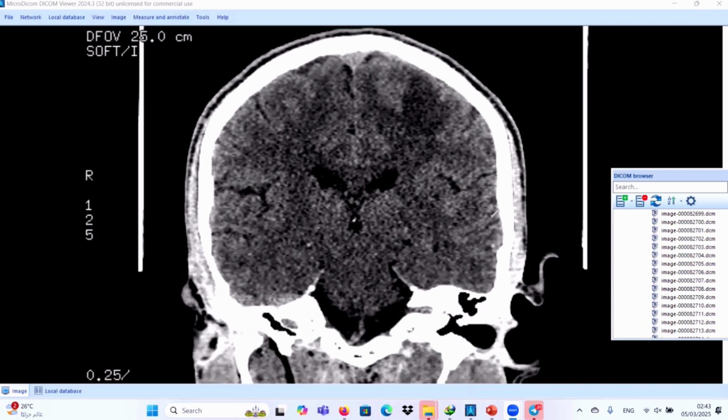So please, one of the great and common mistakes, especially for the juniors, once we have a hypodense area like this one, please don't diagnose this one as acute cerebral infarction, because this one is totally different. This is considered as vasogenic brain edema, not cytotoxic brain edema. We have the main two types of the brain edema, cytotoxic brain edema and vasogenic brain edema.